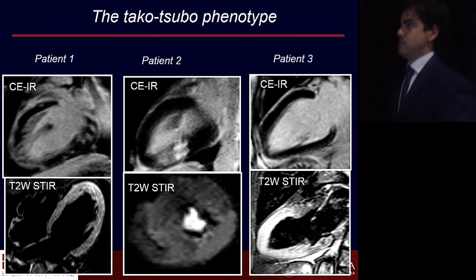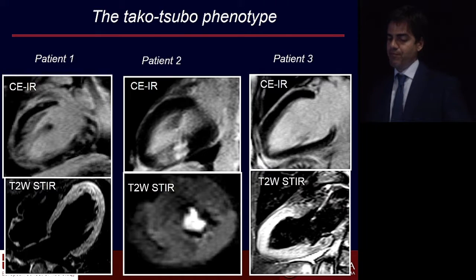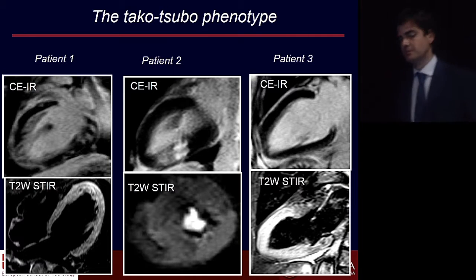About patient number 2, do you see an ischemic pattern on the first line? I would say yes. The image quality of T2 is not the best. There might be high signal intensity with thickening of the wall consistent with edema.